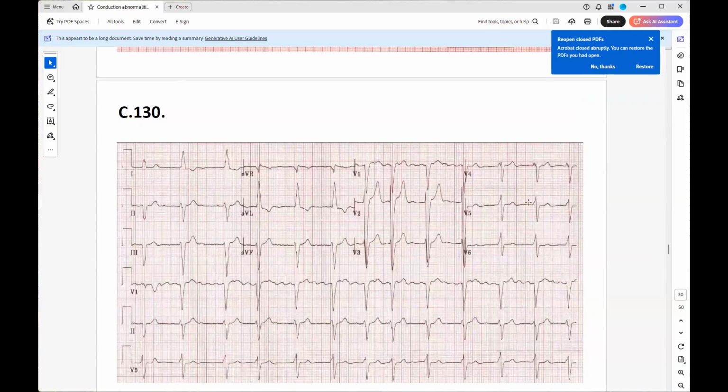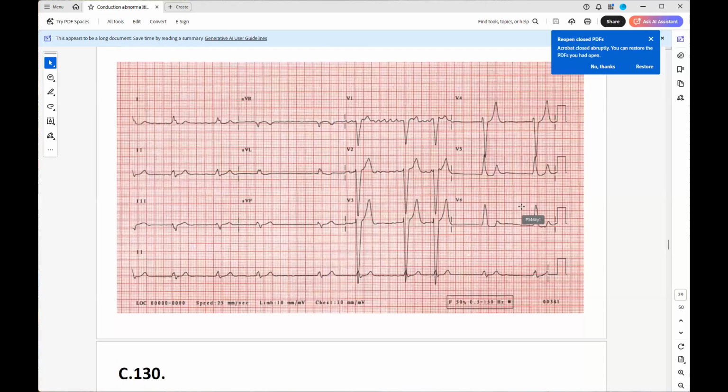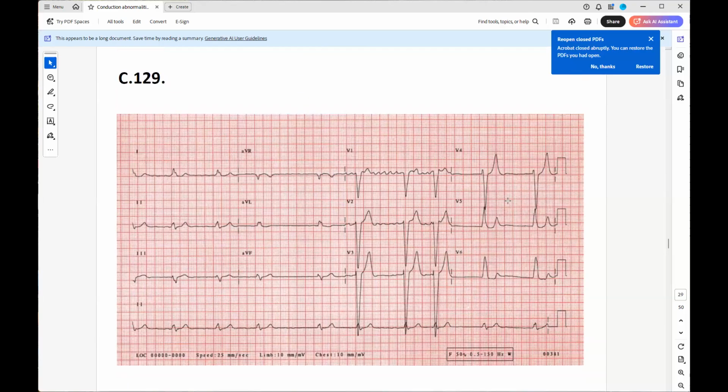Yes, I think, yes, one more. Yeah, that one. Okay. So I think this graph is rhythmic. This is rhythmic. It's not. That's distance, and that distance, and this distance, and this distance. I don't think that they are the same. This is arrhythmic. Arrhythmic, okay.